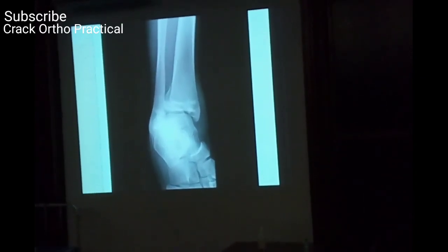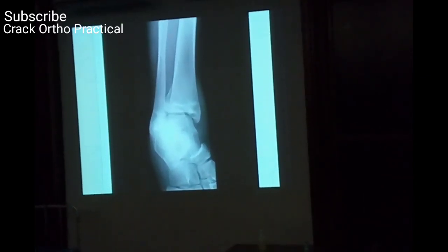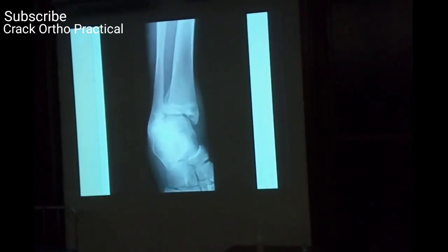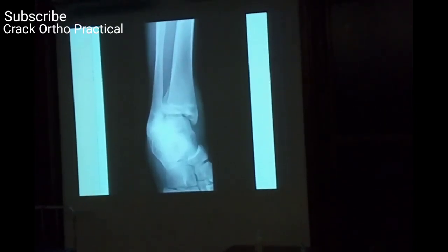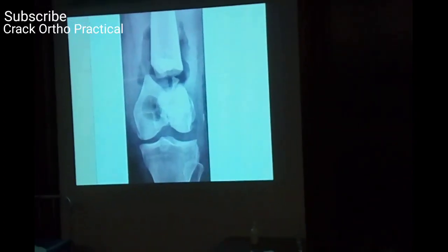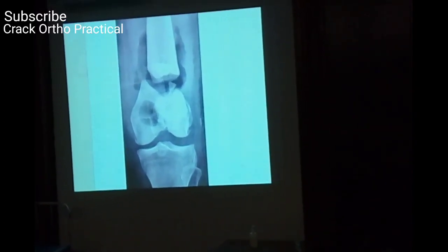Right. So there is a fracture in the epiphysis which is in a sagittal direction. Then there is an axial split of the physis. And then there is a coronal fracture at the metaphysis. So it is important that we don't miss this. Somebody?